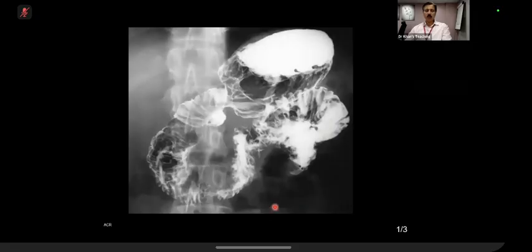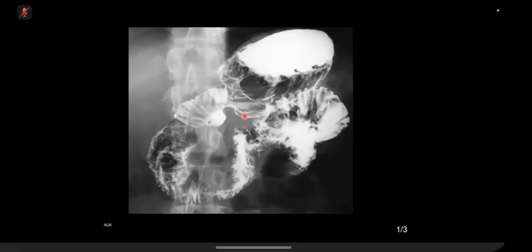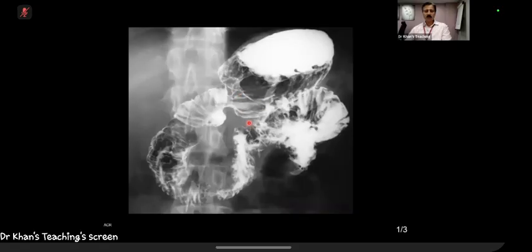And this, on the other hand, over to candidate 9. Do you see the antrum here? Yeah. So is it normal or abnormal? You know the shape. I am asking you, the question is very specific. Gastric antrum, is it abnormal? So what is happening? So this is the duodenum.